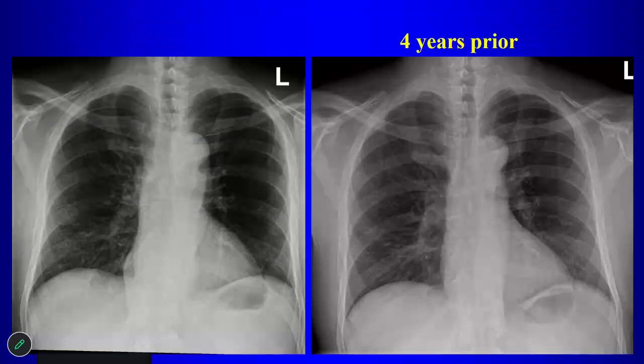Yes. What looks different? Okay, it looks like we have a left posterior peri-spinal mass. Okay, so this line here is what? That's just the aorta. Yeah, it's the aorta, and then there's this extra bulge here, right? So here's the aorta, and now there's this new bulge on the left side, right? Anything on the right side? Yes, okay, what is this guy? That's like a bulge of our spine.